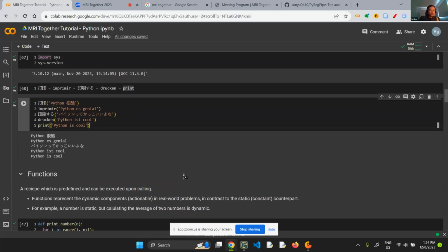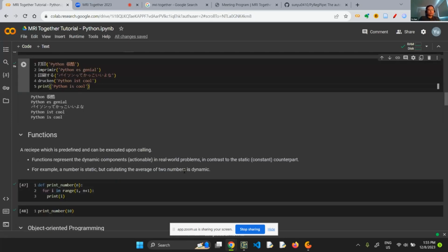If you know some Python, what I'm going to talk about are some of the essential or vital pieces in Python that will build a good foundation for your, say, image analysis down the track. Because if you do not know these concepts, there are some pitfalls or behaviors that are very hard to explain. Okay, so the first important concept is function.